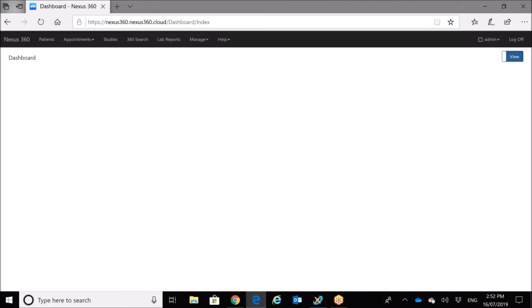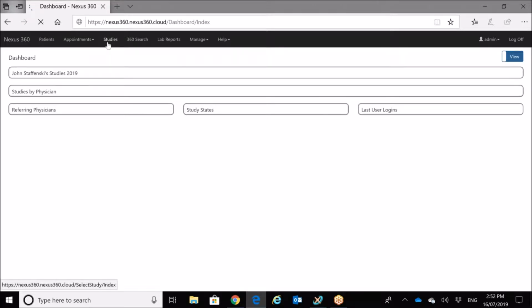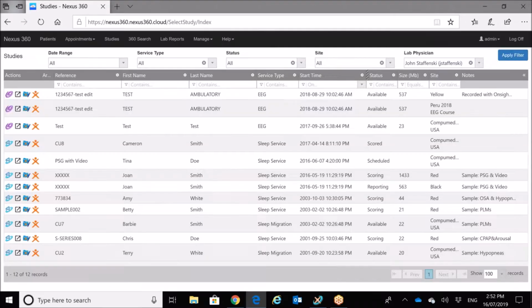So the very first thing is when we log in, if we have a look at our studies tab, assigning lab physicians will vary depending on how you set up group permissions, how you set up the study access rules, and there are other video tutorials on YouTube that will help you to understand this.